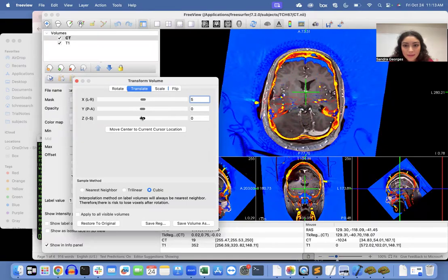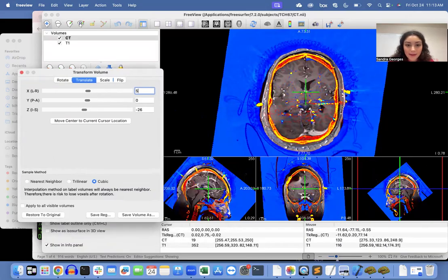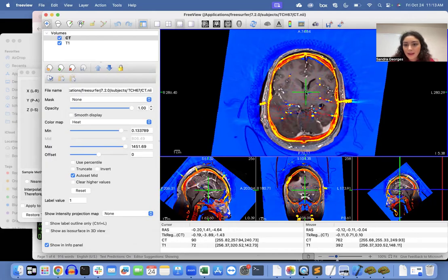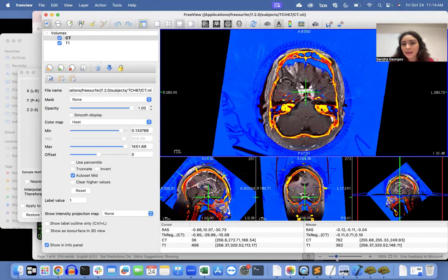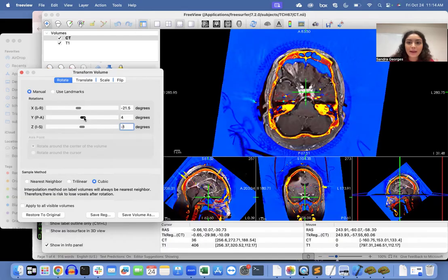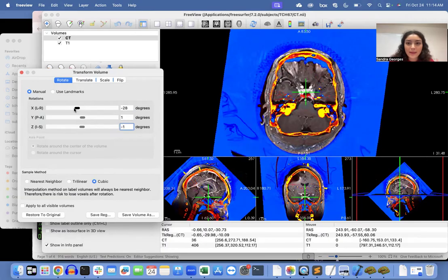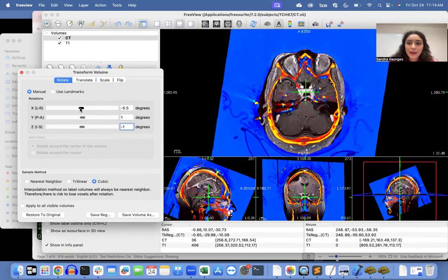So there we go. I'm also looking at, oh, sorry, I'm covering one of the other views, but I'm also looking at some of the other sections and slices so that you can kind of see a little better. I'm gonna toggle my cursor so that I can actually see where the eyes come in, because that will help me encapsulate them a little bit better. Not with this one, but with this one. So in the rotate, we're gonna start to see where the eyes come in, and I'm wanting to best encircle those.